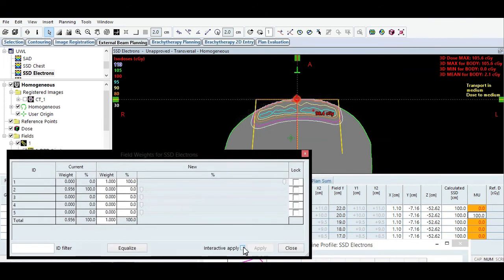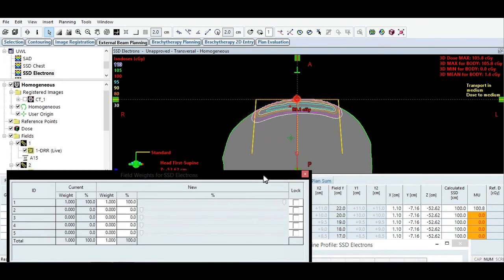Contrast this with 6, put this on interactive apply. So 6E isodose lines, 9E isodose lines. If we go to 12, 12E isodose lines, you can see how these lower isodose lines keep moving deeper and deeper in the patient. Even at the 95% isodose line, you can tell it has a broader range, and this makes sense because the higher electron energy we go to, the broader peak our Dmax and 90% isodose line starts to display. So this is 12E.